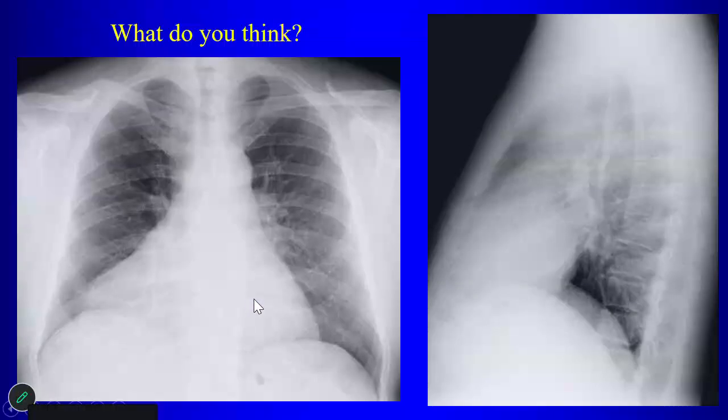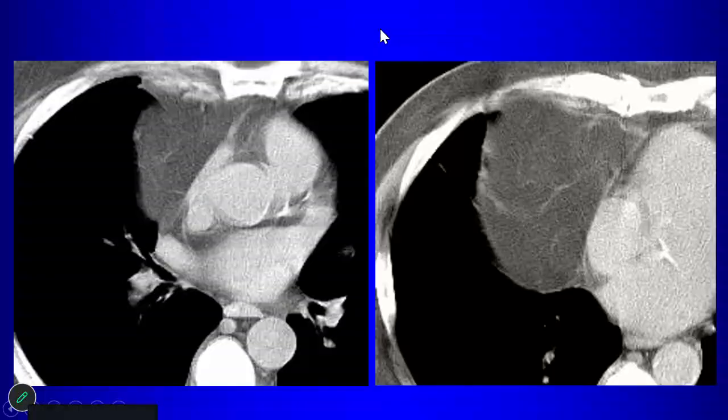So here's another patient who has a mass here that's in the right cardiophrenic angle, okay? And then here's the appearance on the CT. So what do we have to say about this? It looks mostly fatty, right, but there are some soft tissue elements within the lesion. So there are two things, or maybe three, that would enter the differential diagnosis with this.